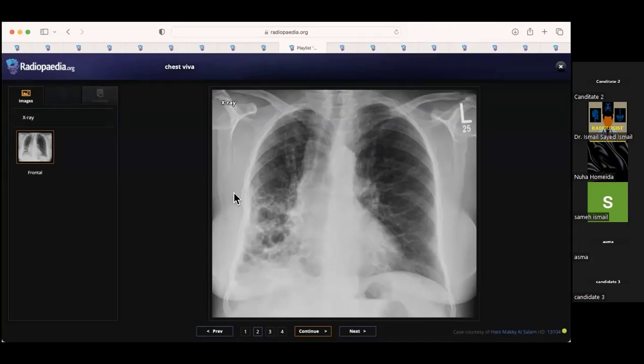So in a female patient with these multiple cystic areas and volume loss of the right lower lung lobe and zone, and silhouetting of the right heart border and the right hemidiaphragm, I'm thinking of a more chronic process involving the right lung. I was thinking of usual interstitial pneumonitis, but the thing is it is only unilateral. It's not bilateral involvement, which is not typical in this case.